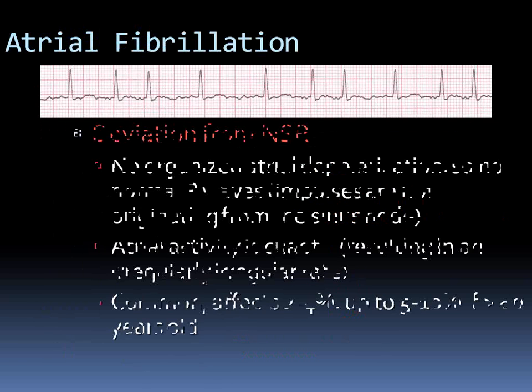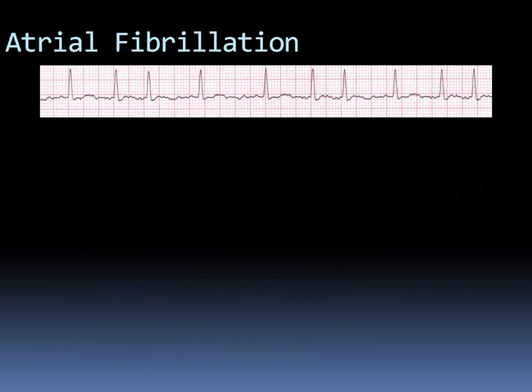Dr. Siwane? Yes. How do you determine that the last up wave before the QRS is not a P? Okay, so two things that you should see: first of all, the P wave morphology. You see how weird this P wave looks, and then you see the baseline.